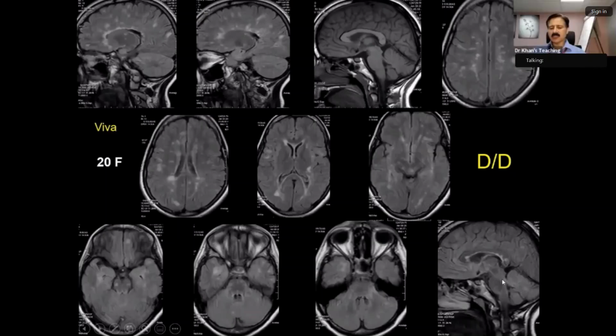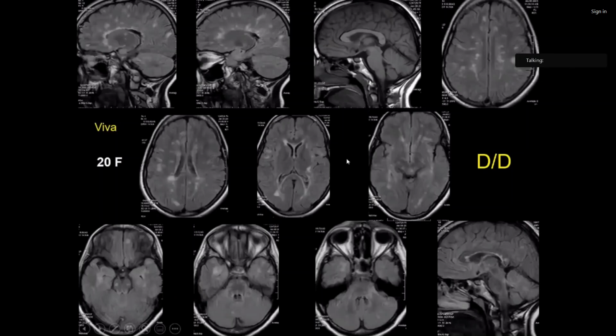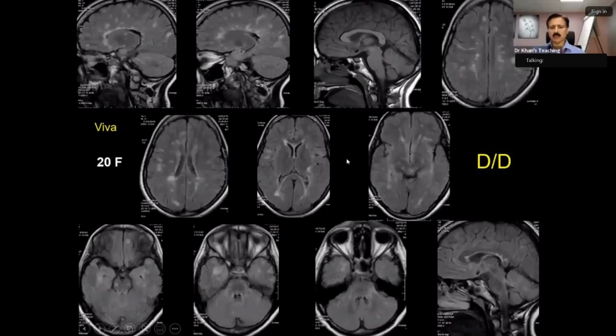This is the superior cerebellar peduncle, which is the connection between the cerebellum and the midbrain. And again, some of the studies have told us that there is high specificity if there are plaques there. At times you will see them on axial sequence also. So these are the features, which was correctly pointed out, that go in favor of MS.